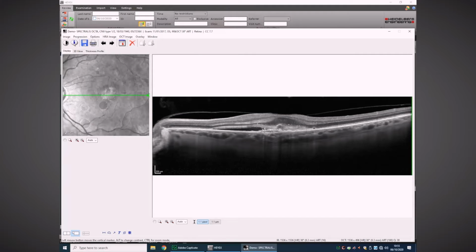And here you can see in our B-scan that there is a disruption to the retina. You can see subretinal fluid here, and you can see some type of lesion, but maybe at this point you don't know what type of lesion it is. Now, if you're not going to do an FA, you have no information about leakage, about changes to the blood-retinal barrier.